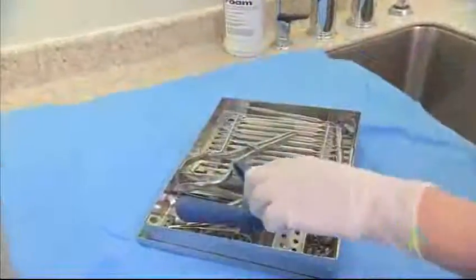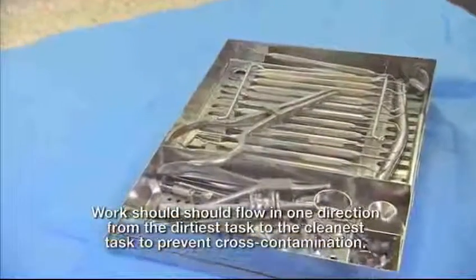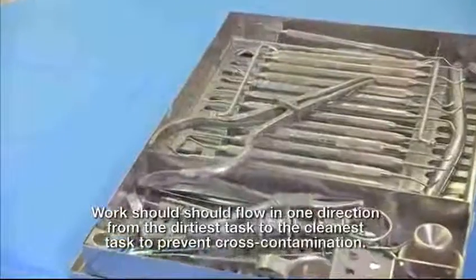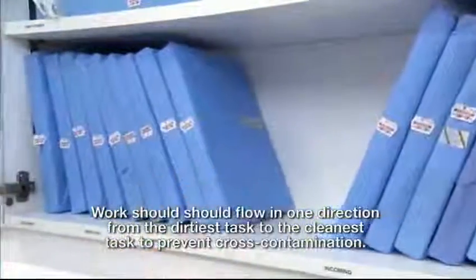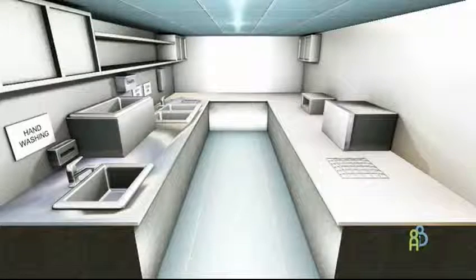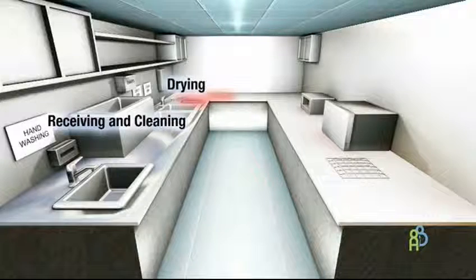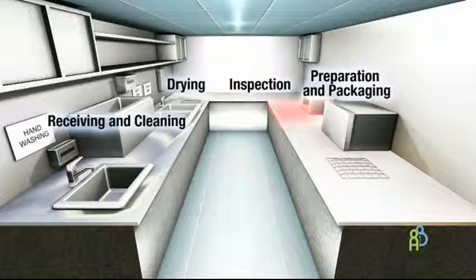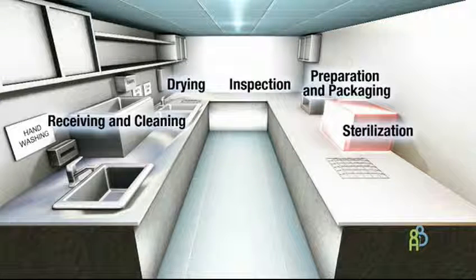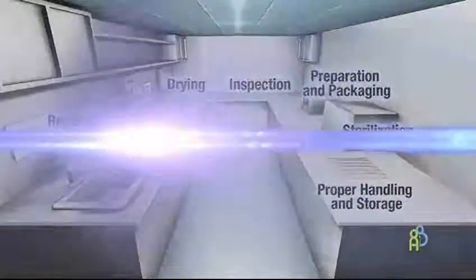One-way workflow is the process of ensuring that reprocessing work flows in one direction, from the dirtiest task to the cleanest task, in order to prevent cross-contamination. A typical workflow would include receiving and cleaning soiled devices, drying, inspection, the preparation and packaging of devices for sterilization, sterilization itself, and finally, the proper handling and storage of clean and sterile devices.